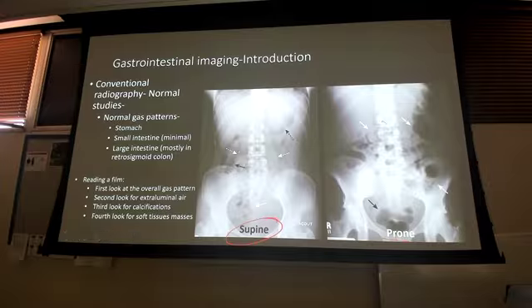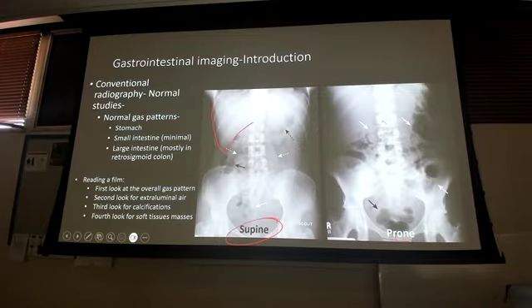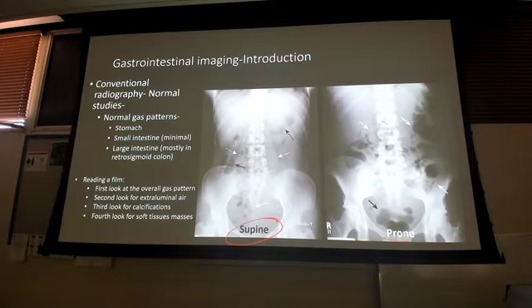Take a look here. Can you follow the liver down and see how it comes down here and then it kind of comes up? Does everybody see that? We'll have other pictures with liver, but I just want to show you. Here's rib 12. And the liver comes down slightly past the 12th rib and comes up. This is that soft tissue line that you're looking at. That's normal. The liver is supposed to be slightly past the 12th rib.